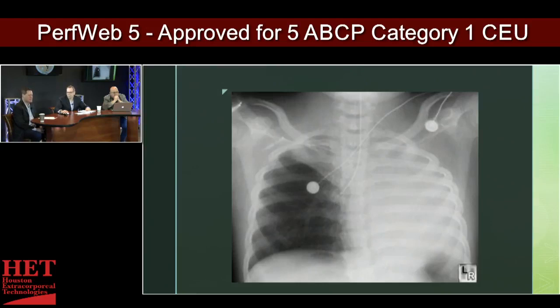And this could be a tension pneumothorax from a massive pneumothorax caused by either they primarily came in with that, or oftentimes you could see that if they get right main stemmed and you have a respiratory therapist or a resident or a med student that's very aggressive with the bagging, you could cause an iatrogenic pneumothorax. Mediastinal shift because of the tension pneumothorax. And so you don't see the heart border here on the right side because all this is under such extreme pressure and tension, everything is on this side.